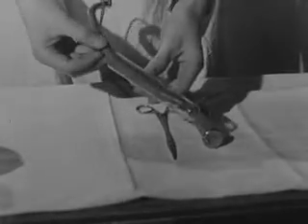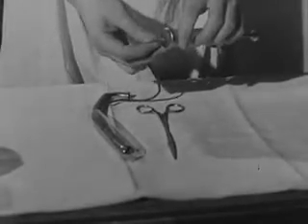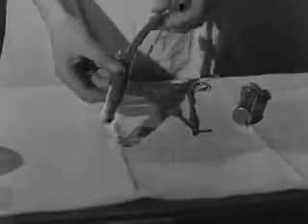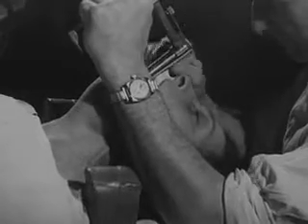An alternative to gauze packing is the Goodell Waters inflatable cuff, fitted onto the endotracheal tube itself. The tube fits quite loosely into a test tube so long as the cuff is deflated. Air is pumped into it by a syringe attached to the supply tube. This is then clamped off. As you can see, the cuff now fits firmly against the walls of the test tube that makes a watertight packing. The cuff tube is inserted into the trachea in the same way as an ordinary endotracheal tube.